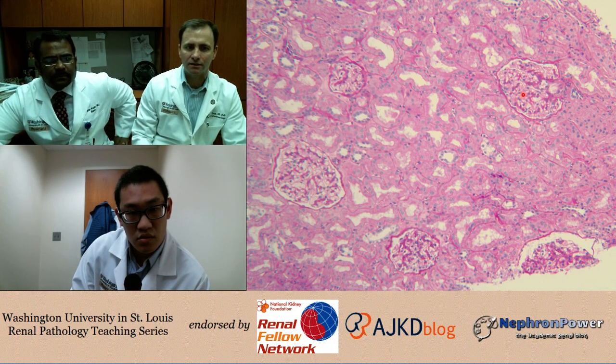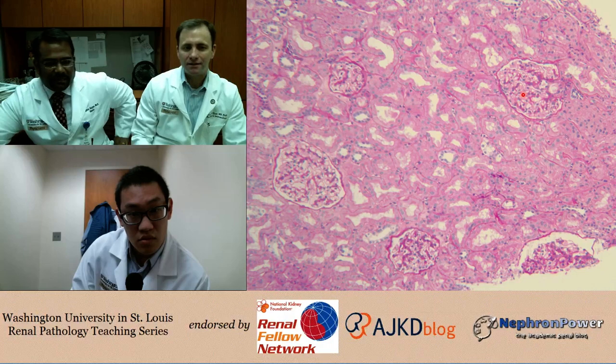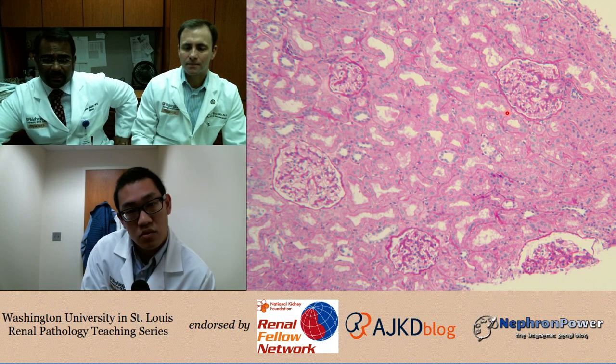Okay. Well, before we hone in on those glomeruli, let's talk a little bit about your differential and what we would expect to see for those different diagnoses. So minimal change first, that's pretty straightforward. Right. And over here, I'm not really seeing too many things jumping out at me, so yes, minimal change could definitely be in the differential.